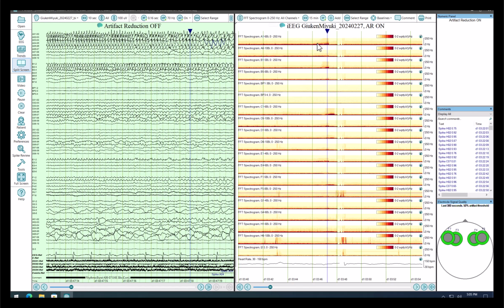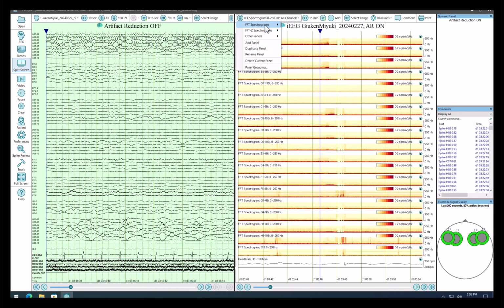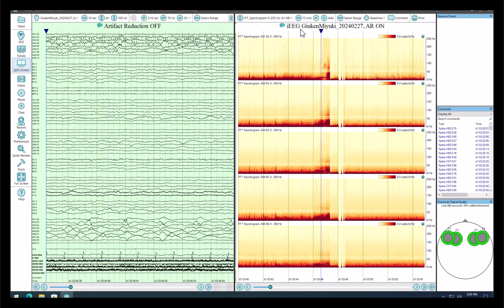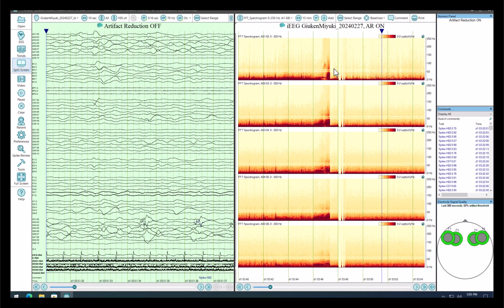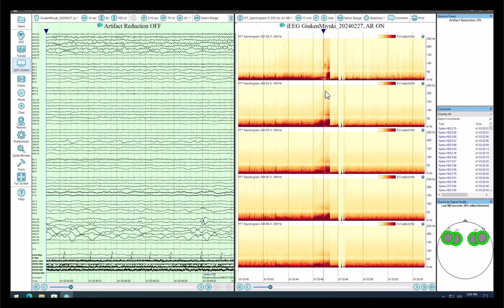But we can also start looking at this by hardware group. And here's our first hardware group where we can see that change depicted there. Now, let's see if we can show this in a way that's a little different, where we can see the changes at the higher frequencies. Because again, we have much higher amplitude at these lower frequencies. And we're still processing the EEG, that's fine. Doesn't hurt it a bit.